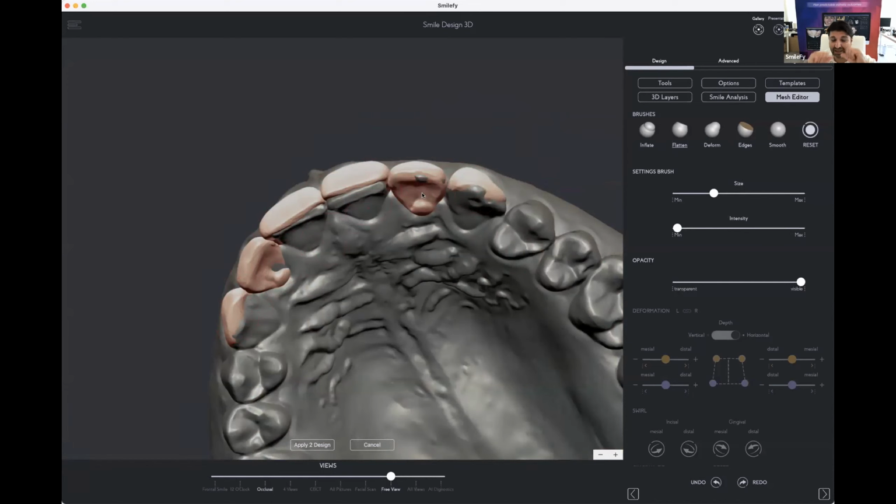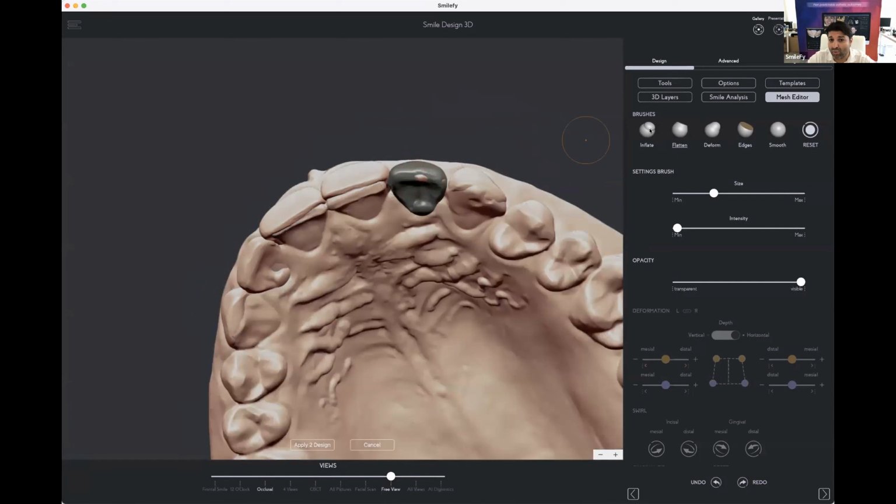So you click the whole design, the shells on the laterals, and canine and centrals are going to be on top of the teeth. It depends on the way you want to design your shells, but that's exactly the way I showed you, like here.